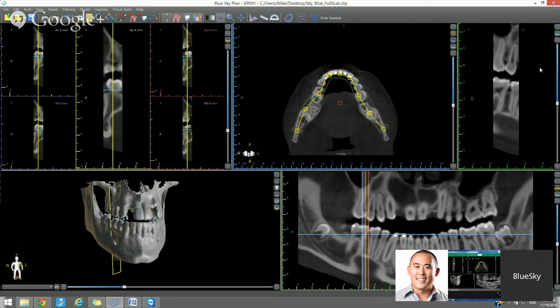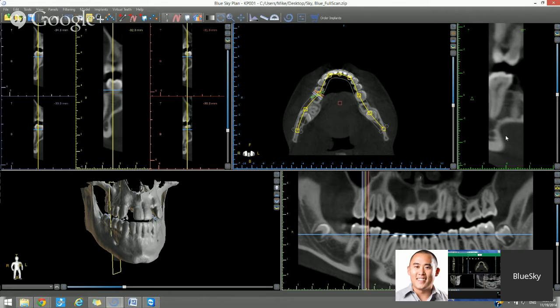The cross-section view, let's go to the tangential view in the top right. The tangential view as well could be enlarged to take up the screen with the top button. The second button is our screenshot camera button. And here we could go through the slices as well using the slider, scrolling through the wheel of our mouse, or by pressing the up-down arrows by the slider. And the mouse functionality works the same way.